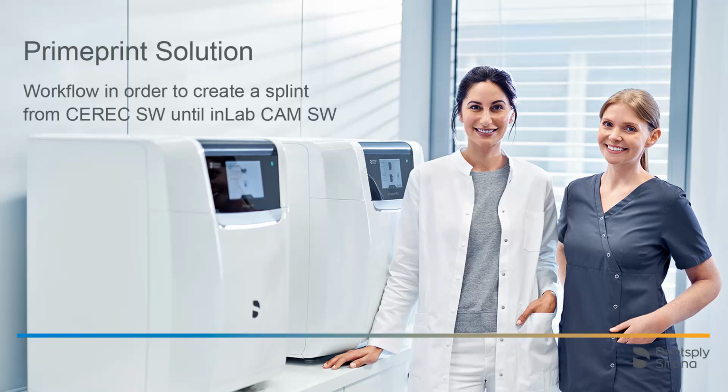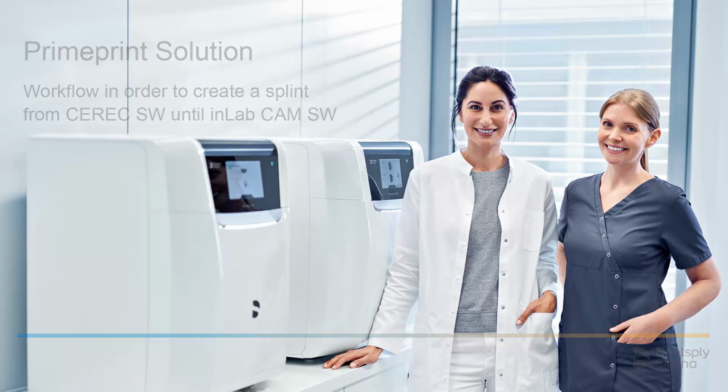Welcome to this video tutorial on the topic of Primeprint Solution. In this video, we will demonstrate the workflow in order to create a splint. We will guide you through the CEREC software and the in-lab Splint app to the in-lab CAM software.